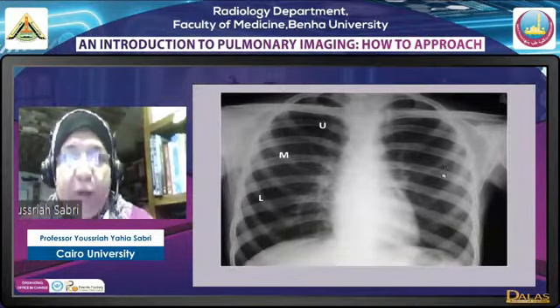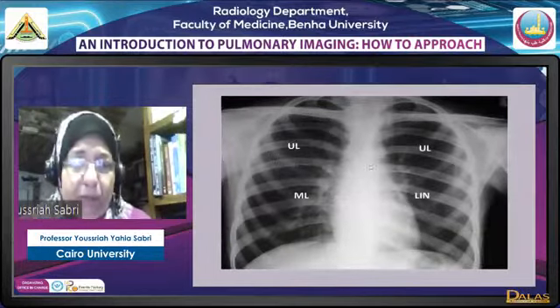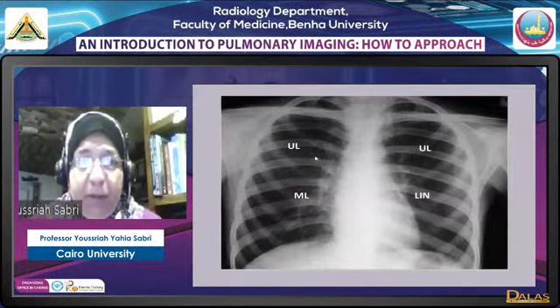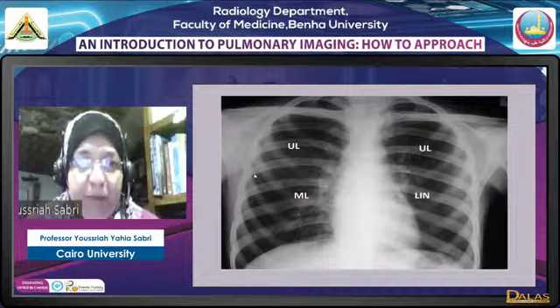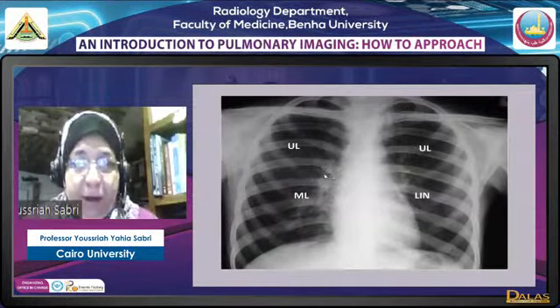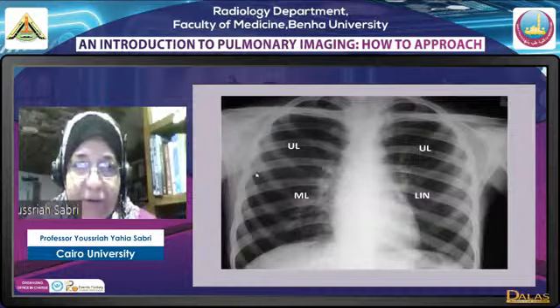في طريقة ثانية لوصف الليجنز, lobar. The upper lobes, على الأبر lobes على الناحيتين. عندنا بمنتهى البساطة, this is the hilum extending a line from the center of the hilum peripherally. Okay, what is above this line here is a triangle on both sides. It's representing the upper lobe, and from this line we have another triangle.